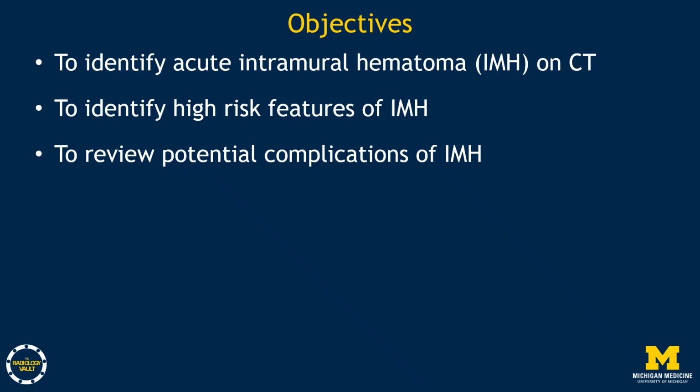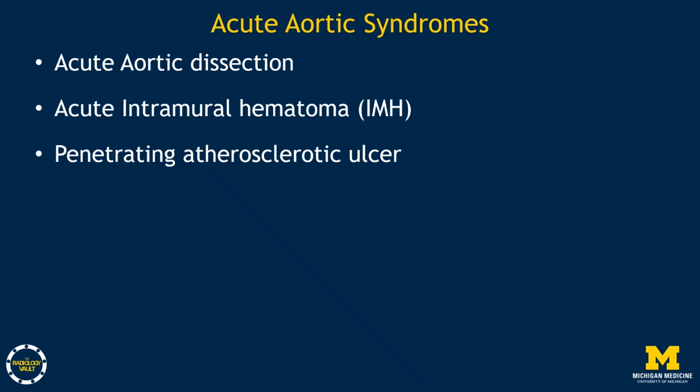In this video, we're going to learn how to identify acute intramural hematoma on CT, to identify its high-risk features, and to review potential complications.